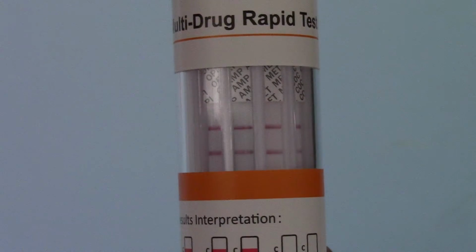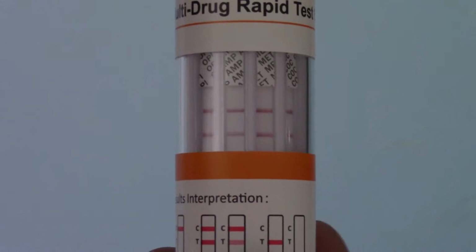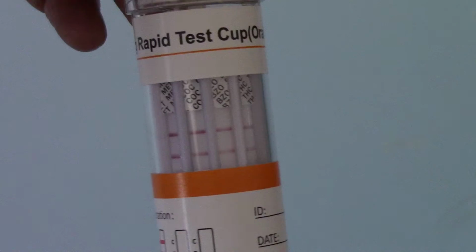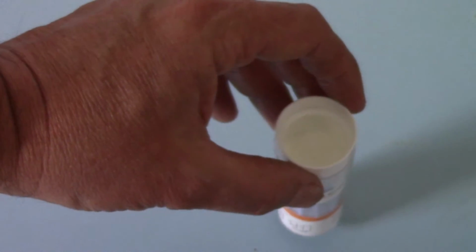So there you have it. That's the DSD-867 saliva barrel drug test. Very easy to do. The key element in running these tests professionally is to ensure that you collect a good quality saliva sample with that swab on a stick, and to do that, the key element is to both move the swab well around the oral cavity to pick up any drug residues, particularly the cannabis residues that may still be lingering in the mouth, and also to adequately saturate that swab with enough saliva that's going to be discharged to run the set of 6 drug strips that are loaded into these tests.